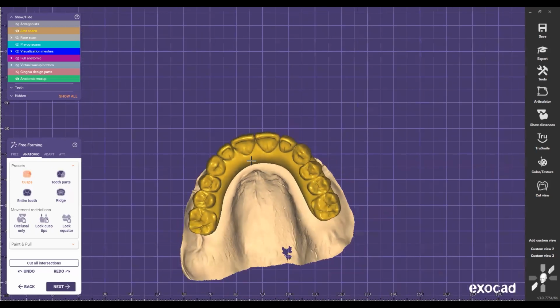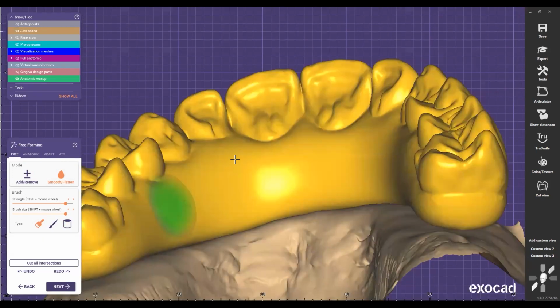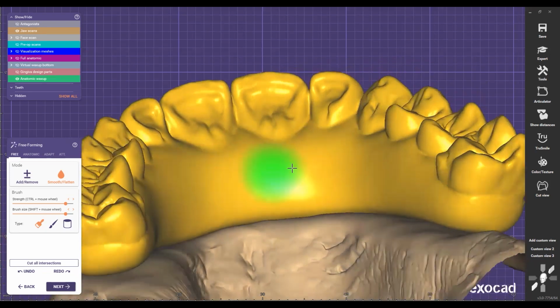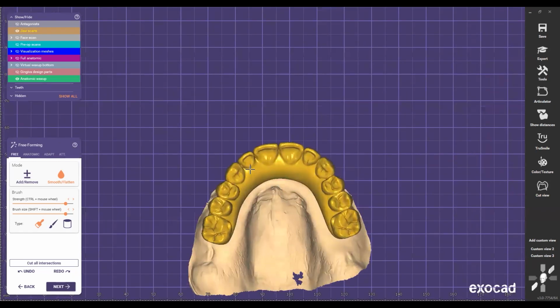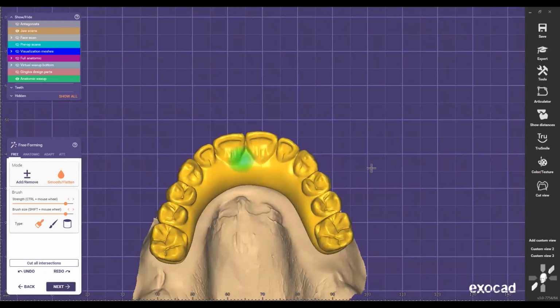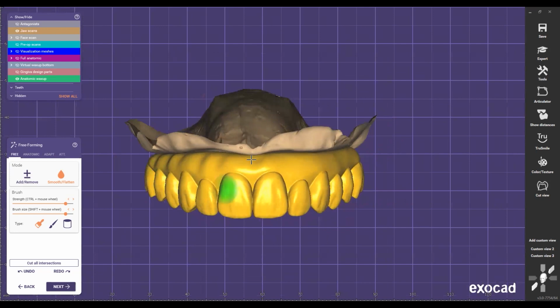So now in the lingual, I can do that. I can just start smoothing this, especially these areas right here, so the patient's tongue feels much smoother and nicer there. Remember, if you guys are using something like Mio, or you just polish that area, it's not gonna affect anything there. But the most important for me is the facial and the bulk to look beautiful. That's where we're gonna be able to see a nice, beautiful smile.